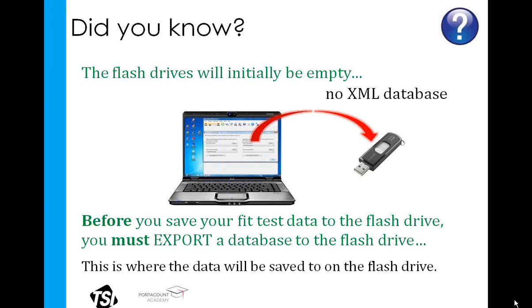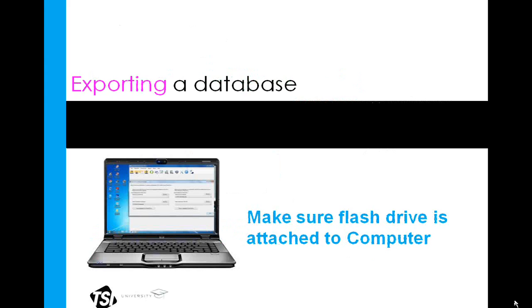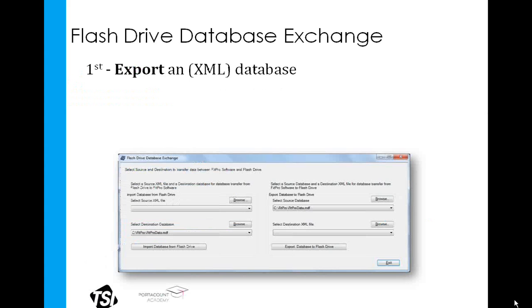And again, the process of creating an XML database on the flash drive is also called exporting. At this point, we're going to walk through the entire exporting process. So if you have not already connected the flash drive to your computer, please do so now. The export function of the flash drive database exchange window is on the right-hand side.